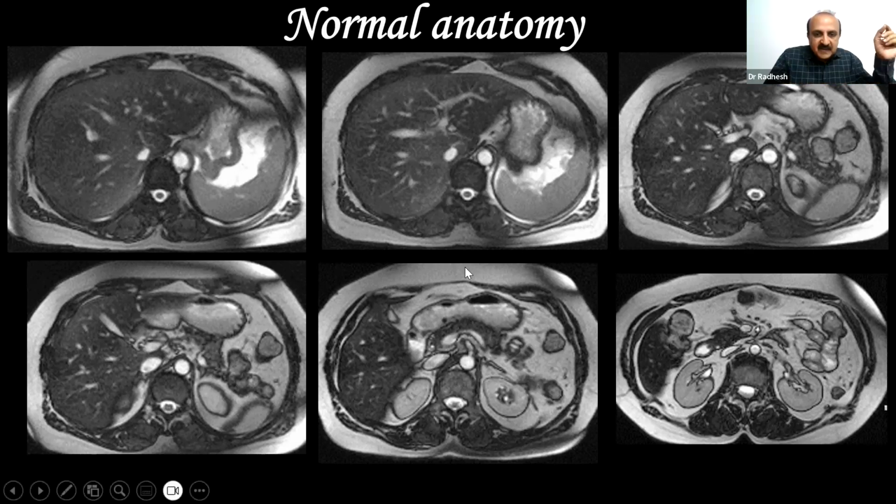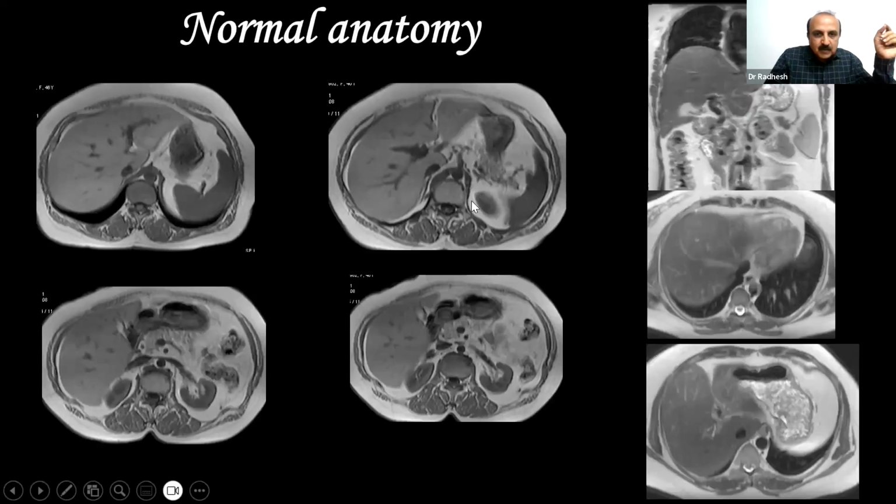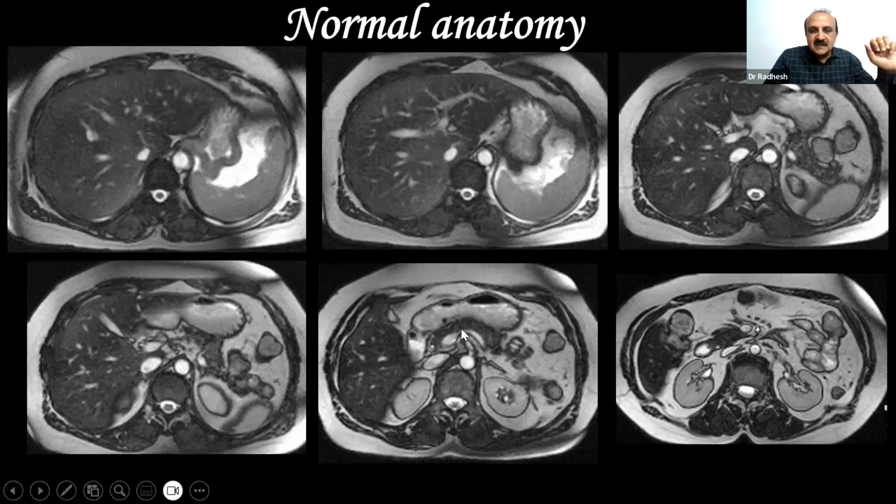So now you see the difference here. I'll just show you. I'll go back. You see this pancreas so beautifully seen here as a grayish structure. This is black SMV, and then you see the pancreas. Now look at the gradient. See this? This is the pancreas. See the signal, so different it is. And this is the kidney.